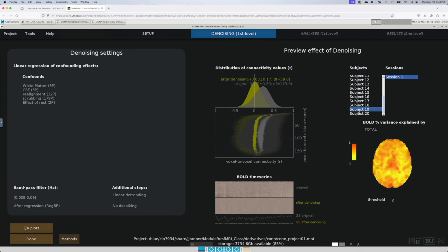Again, I didn't click through all of them, but this is a publicly available data set, and so the researchers have already done a little bit of cleaning of the data, meaning they weren't necessarily including participants' data that would not process well through this pre-processing. That'd be really bad, but it is possible. So you have to go through and check everything.